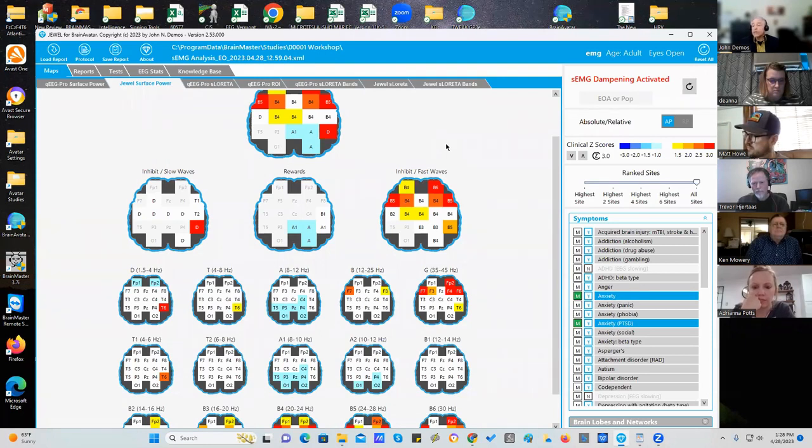An out-of-control teenager, like they're 17 years old, dual bipolar montage, PTSD, dual bipolar montage, panic disorder. It all has value. If the amplitudes or the Z-scores are elevated, if the client basically has a blue map, then now you're into using amplitude training or using Bessel van der Kolk's. So you actually have to do that.